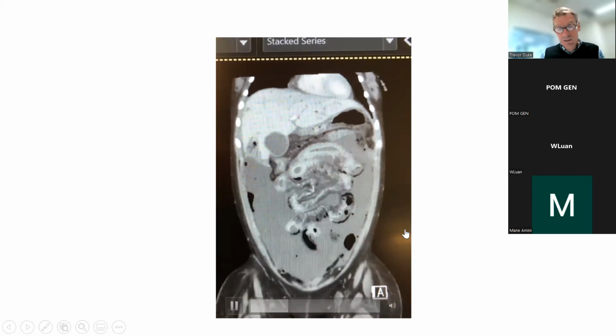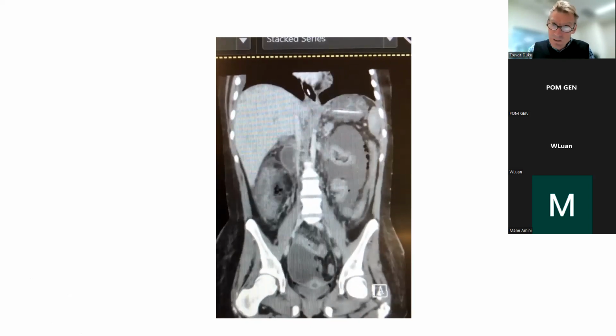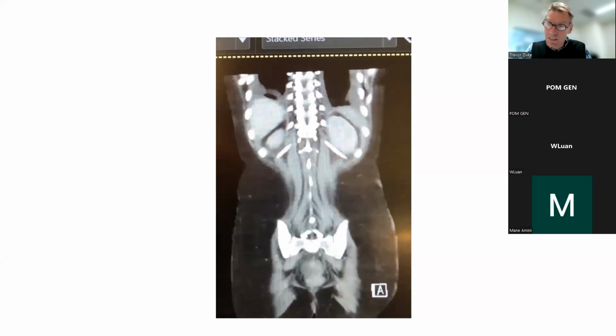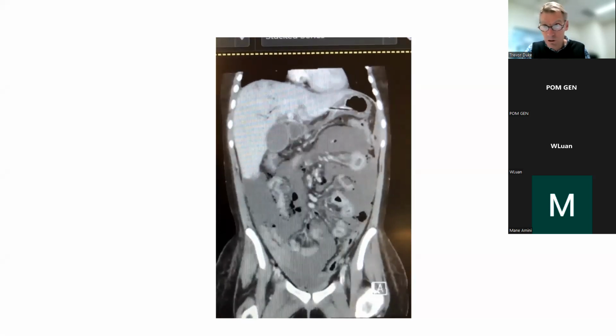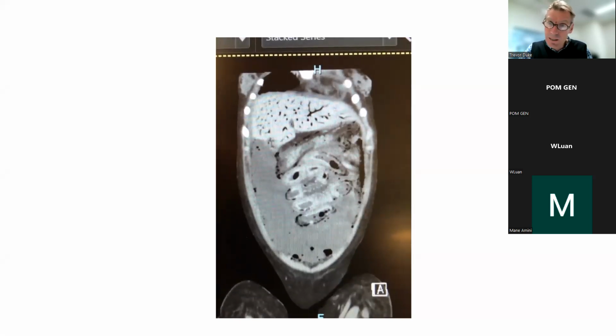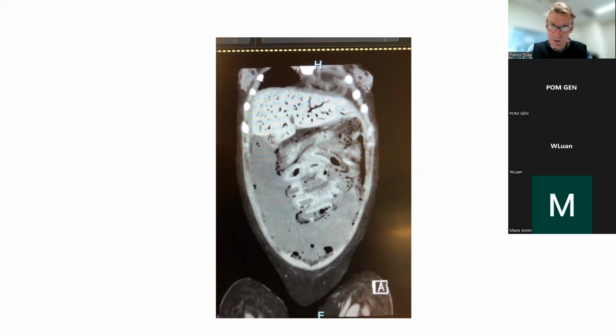So yeah, I guess I wanted to show you some x-rays where when you see the x-ray, you can start thinking about what pathogens or what could be the underlying cause of this. If you saw pneumatosis on an x-ray, then if it was a newborn baby, you'd think about necrotizing enterocolitis, like if it was a premature baby. And if it was an older child, like this child was, then you'd think about Clostridium perfringens sepsis, which, remember, Clostridium are gas-producing organisms. So most likely, when you saw an X-ray like this, you'd say this is probably a Clostridium or an anaerobic infection that's gas-producing. Okay. All right.